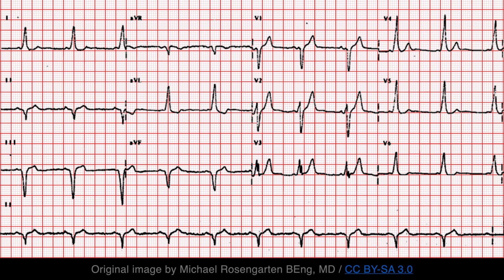A couple pitfalls to keep in mind are that the ECG correlates of Wolff-Parkinson-White syndrome may not be present during sinus rhythm and can also vary from day to day. As well, the Wolff-Parkinson-White pattern can mask the findings that can occur with myocardial ischemia or infarction and other pathologies.